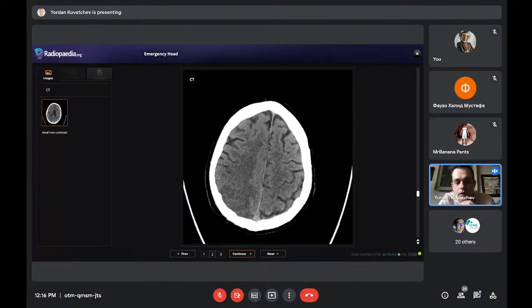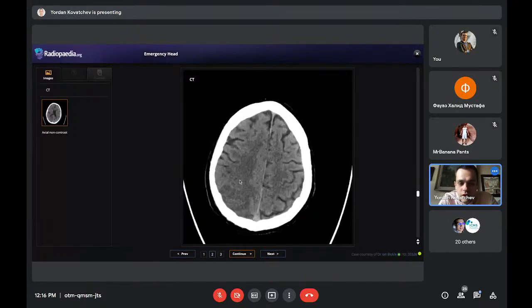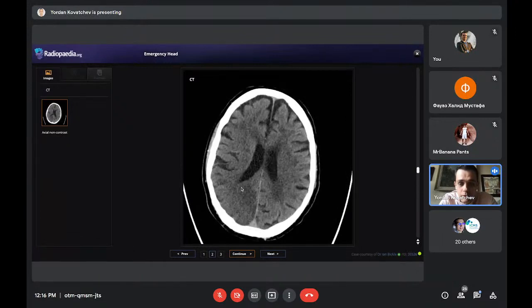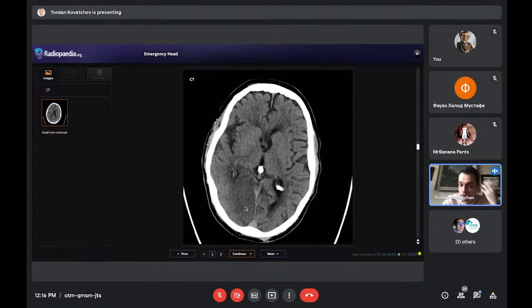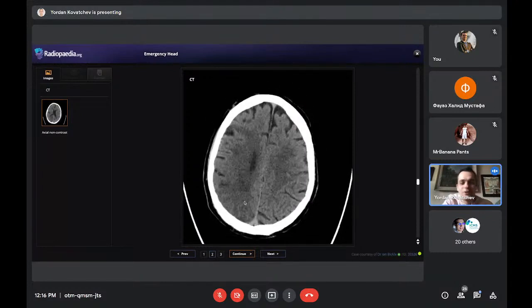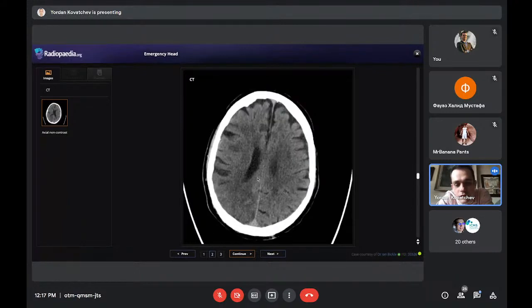of the sulci. We go down and we confirm that these changes are confined within the vascular territory of the posterior cerebral artery. So this is in the occipital lobe. The patient has visual disturbances, so it's logical. We relax, we take a deep breath. What we're seeing correlates to clinical data, because if it didn't, then we would have to think what to do next. But in this case, we see loss of gray-white matter differentiation, cytotoxic edema in the occipital lobe.